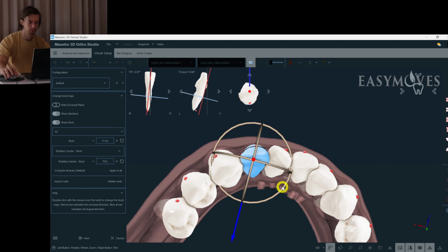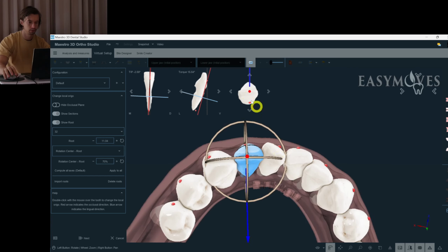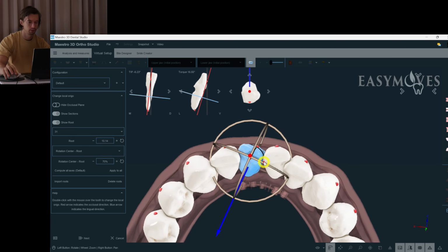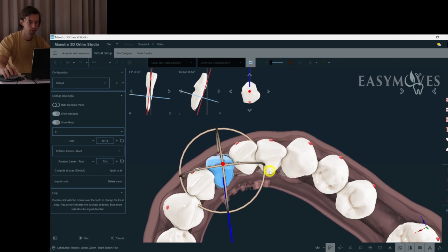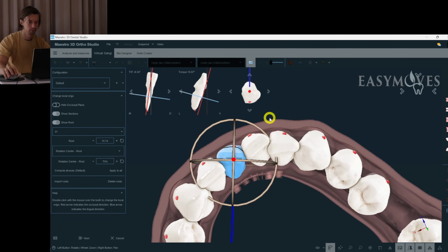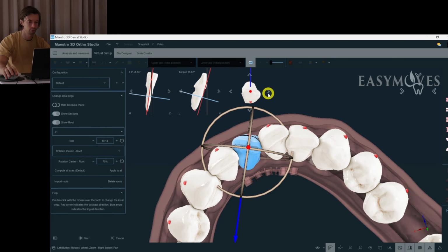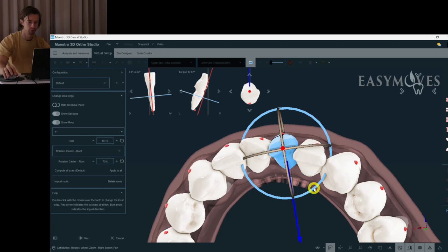because I don't do the segmentation by myself. It takes time, so I outsource it to my employee. But I have to check after him if he placed the axis correctly, the virtual roots, I mean.